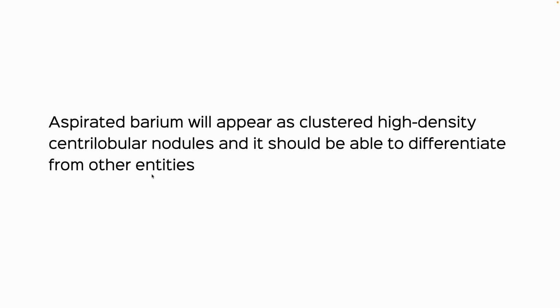And because it has a centrilobular appearance, we know that it's airway related, and that should help us differentiate from other entities. And this patient is clearly aspirating now. That's why the inflammatory bronchiolitis that we're seeing. And then obviously that would need to be taken care of.